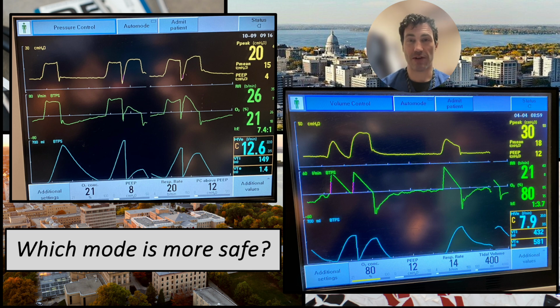So in general, when you are double triggering, try to figure out if it's passive reverse cycling or active due to the patient. If it's due to the patient, fix the underlying condition. Try to work towards fixing their acidosis. You may decrease their respiratory drive with a narcotic if you can't fix the acidosis and want to deal with this. You also want to make sure you're on the right tidal volume for the patient in front of you, which is a bigger discussion than the video today.